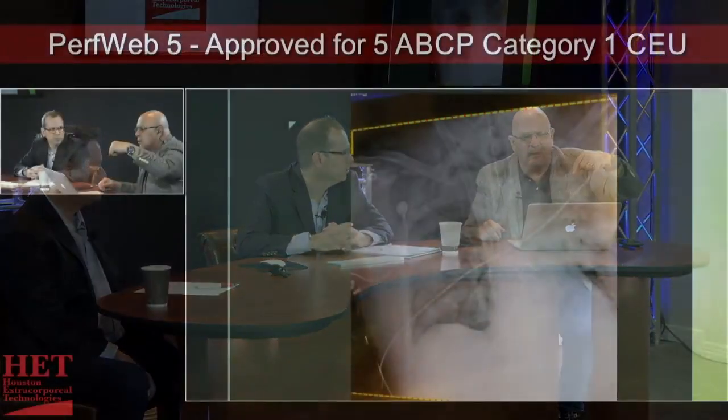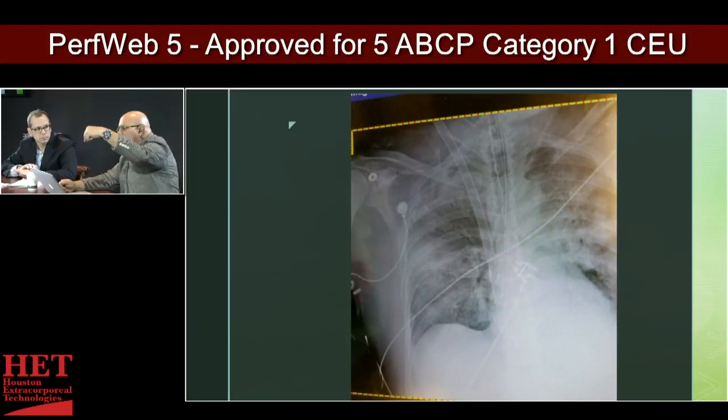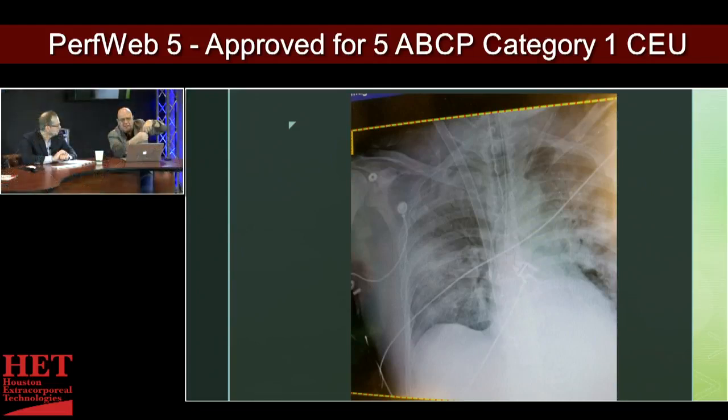So let me ask you this generally. If with that Avalon cannula or catheter, I guess it's both really, it were not far enough in, if it were not in the IVC and it were in the atrium, would you expect there to be a deflection versus it looking like it's really straight down? I mean, would it come up and become more angular, or would it just sit like this above the IVC?